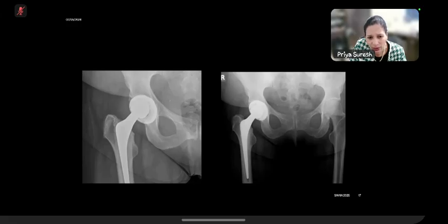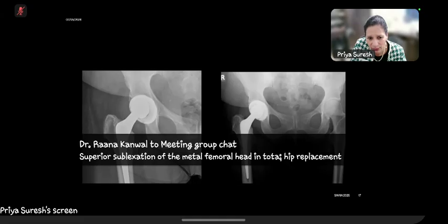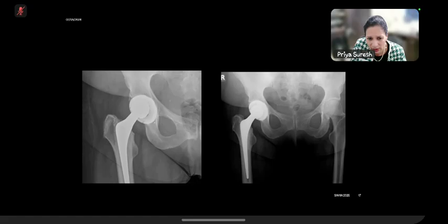Can people think about what is happening between the two radiographs? You must have noticed that the space around it looks very symmetrical here, whereas this one looks very asymmetrical. It's not projectional. See the obturator foramen, it's clean, it's neat, so it's not very oblique.